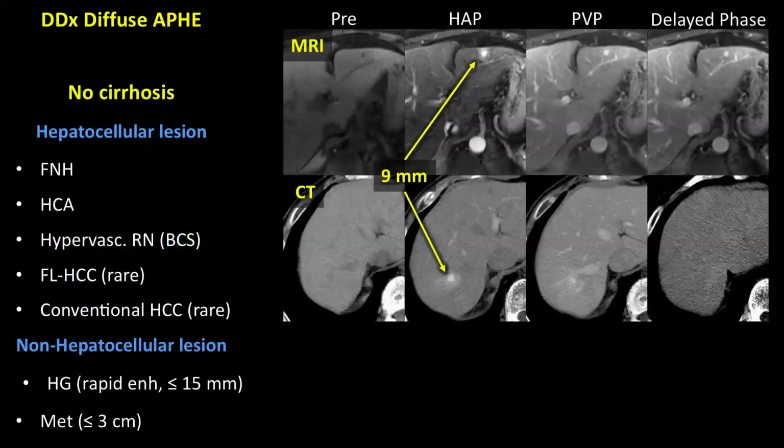Similarly, this hemangioma has faded to isoattenuation. If you look carefully, you can sort of see the hemangioma here before it disappears. It's still a little bit brighter than liver. But how are you going to make this diagnosis? On MRI, it's a slam dunk.